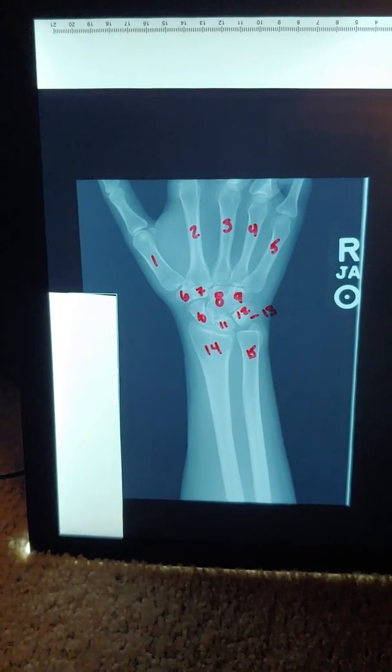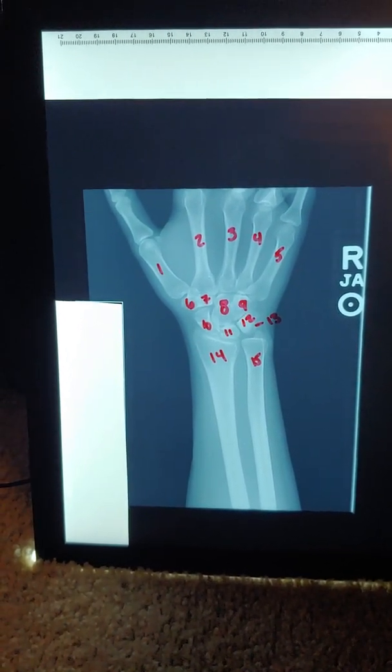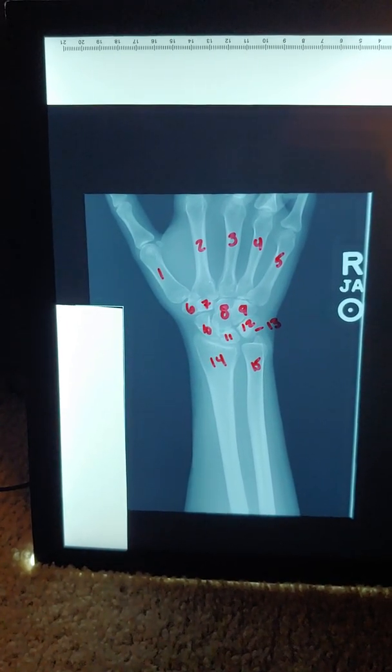The patient was a 20-year-old female. She came into the department ambulatory. The physician findings were normal, no significant arthropathy or acute abnormality.